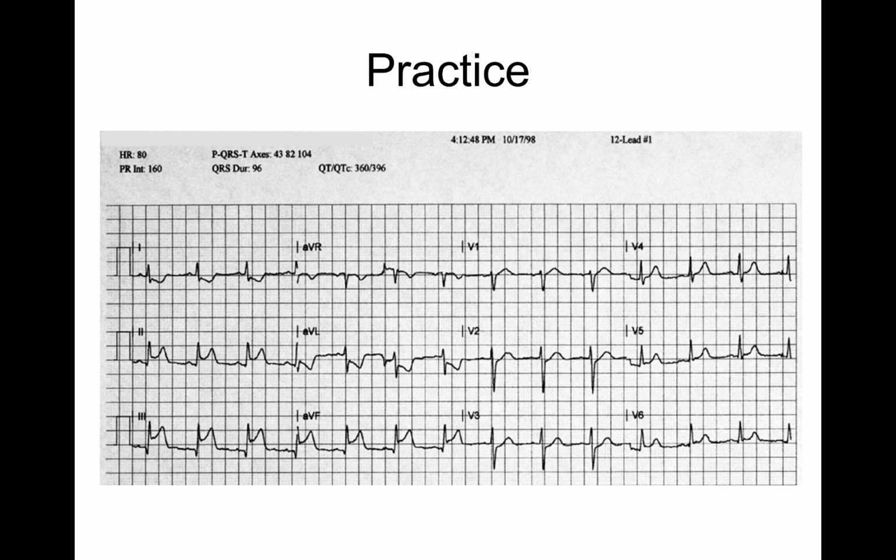This is another practice one. This is your inferior wall MI right here with ischemia going on in the lateral leads. I'm not going to call this a lateral wall MI yet, but it's just about close. If this was a little bit up, I would say positive for lateral, but this is your inferior wall MI.